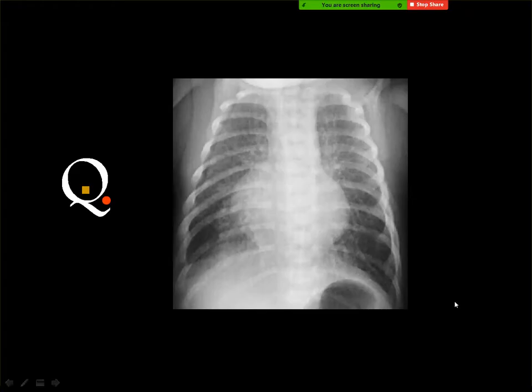Interstitial lung emphysema? No. Respiratory distress syndrome? If it is premature, it is hyaline membrane disease. No. The lungs are aerated, and you can see the vessels. Hyperinflated, let us say. But do you see this line? What do you think? Minimal pneumothorax. Okay, and this image is provided here because of this.